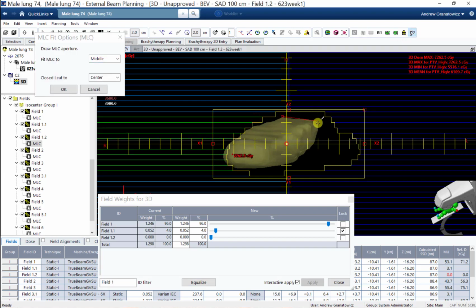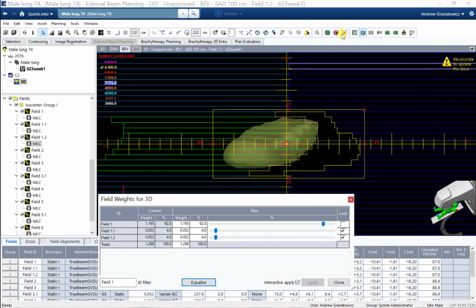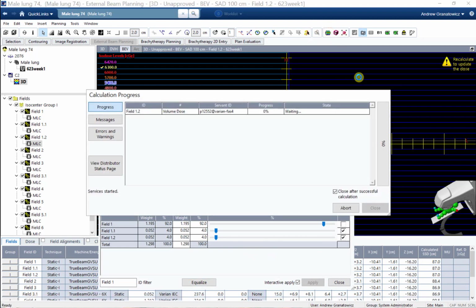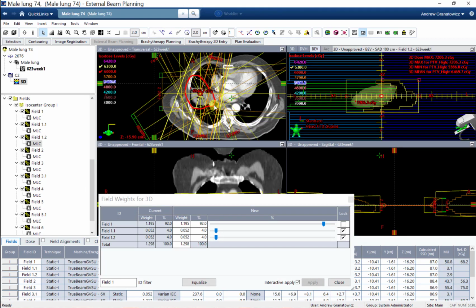It's also important to keep in mind we're trying to block out the 105, which is pretty aggressive, especially for a lung plan like this. I say that because we're delivering dose to the lung, right? The lung, very low density. It can be difficult to get high dose into lung tissue sometimes. Sometimes lungs, you have to let them be a little hotter just to get coverage, especially on the edges in that lung tissue.